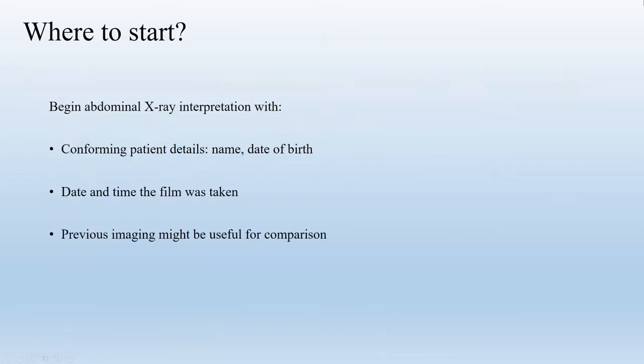So where to start? I would advise to begin by confirming the patient details. It's good, and actually it's right, to know that you are assessing the right patient. So check the patient's name, date of birth. Also check when the film was taken.